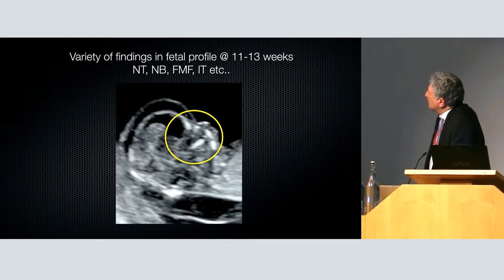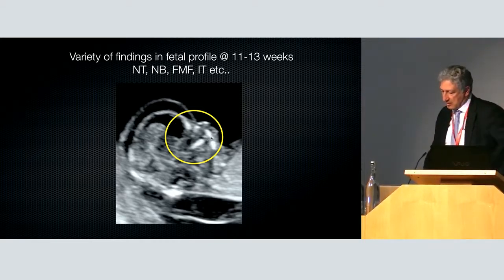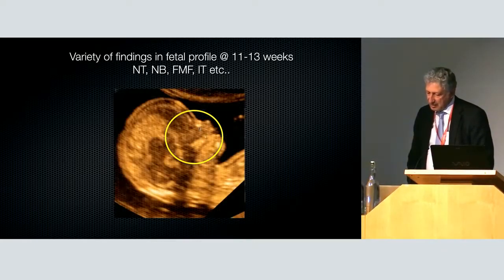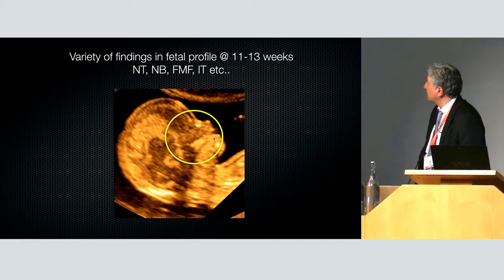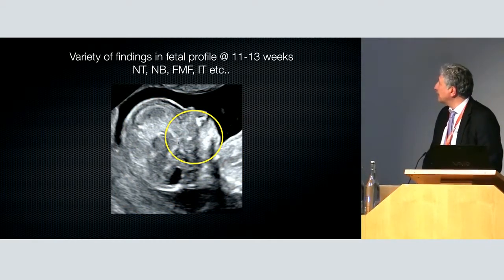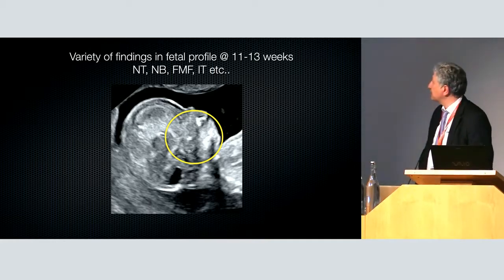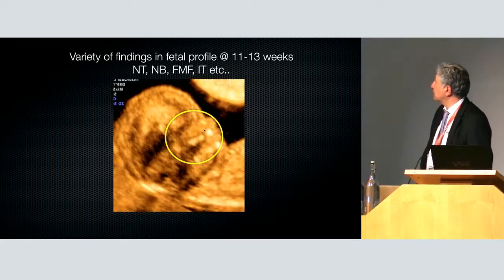And when I showed this to John Heights, I'm really interested in these fetuses having this skin edema until the nose, but you see here there is also a gap with an abnormal position of the alveolar ridge, and here also half of the maxilla missing, and here the anterior part missing as well. So you can take your old images, and don't focus only on the nasal bone or on the posterior fossa, but now look at these conditions as well.